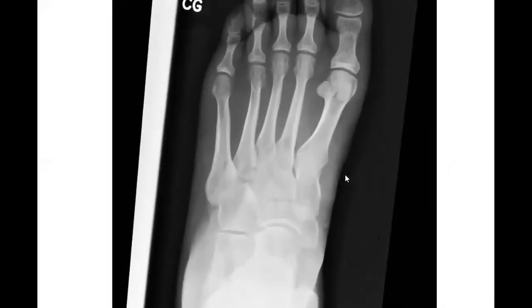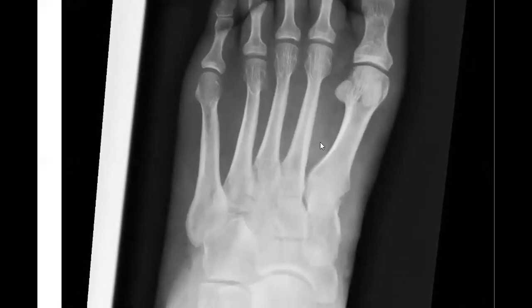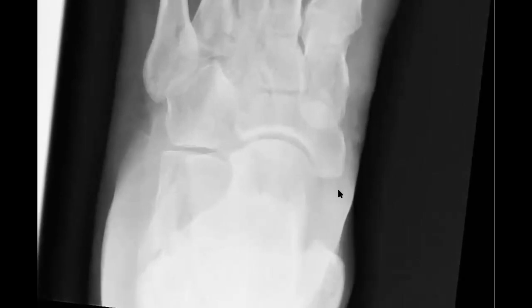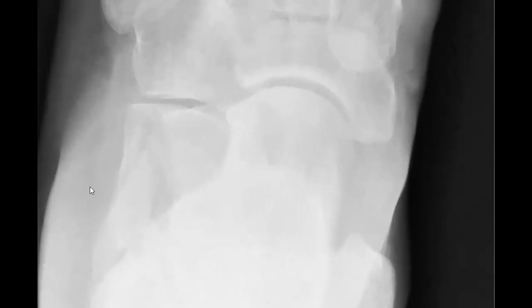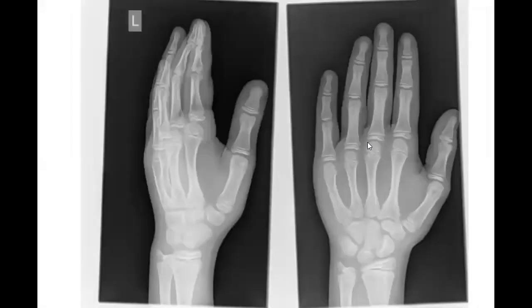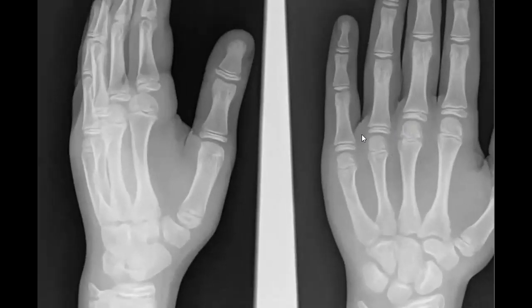This one is difficult because you are going to check everything with your checklist, and after you go until probably the calcaneus, you will find the fracture is here, which is not a very easy one. Sorry, Sumaya, and sorry, Nirmeen, and everyone will have nightmares from this case.